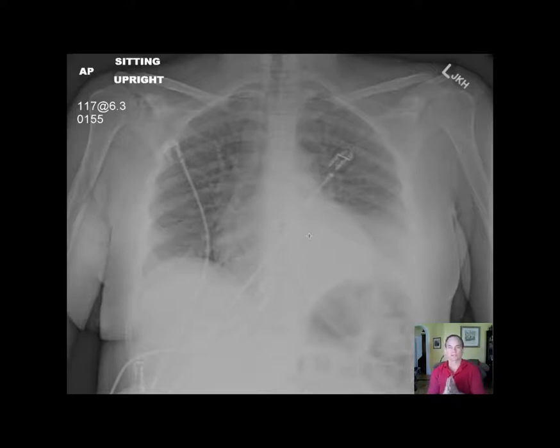So I've made the description of the findings, including positive findings and pertinent negative findings, in the body of the report. So the impression statement, I think, really should be just that, the impression. What you would say if the referring doctor were to call you on the phone and say, "How's it look?" I would not go through the description of all the findings here and there if I didn't have to. I think it's a left lower lobe pneumonia. I would tell him left lower lobe pneumonia. So what's my impression? Left lower lobe pneumonia.